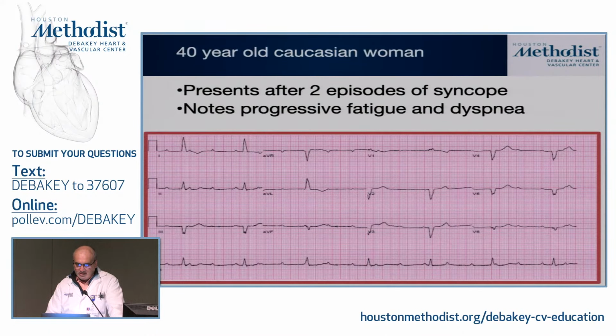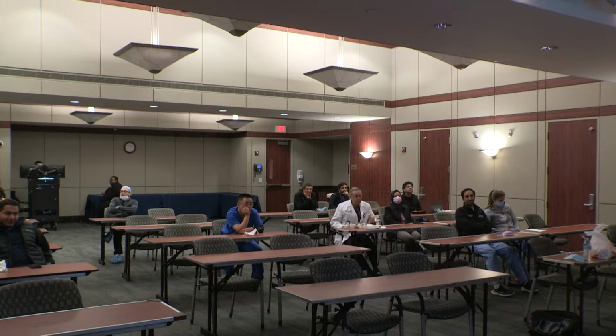So a 12-lead electrocardiogram was obtained, and I want one of the fellows here to... Priyanka, you just came in the room, so we'll put you right on the spot. What do you think of this EKG?